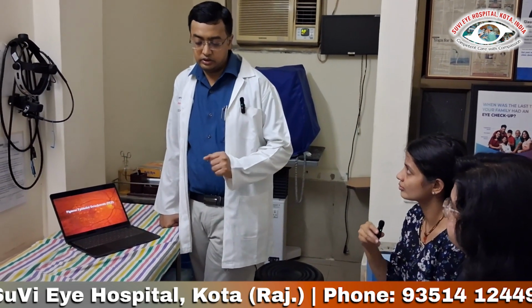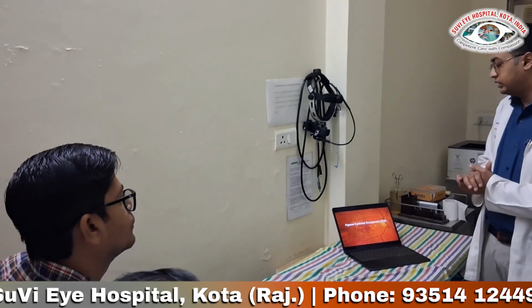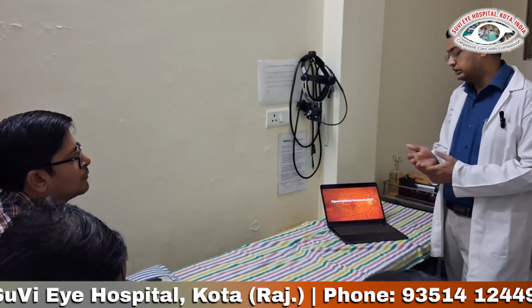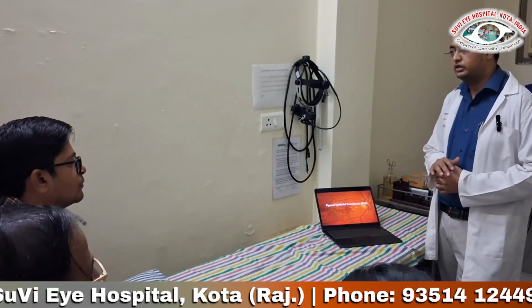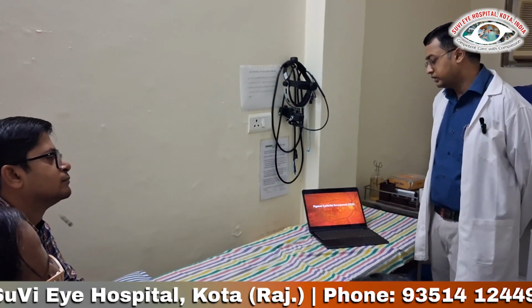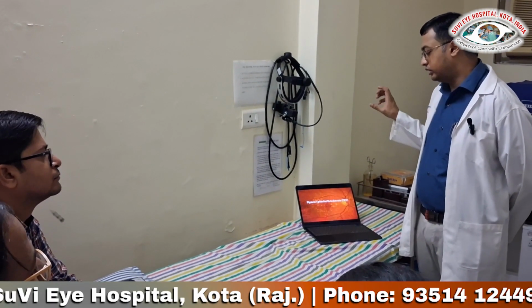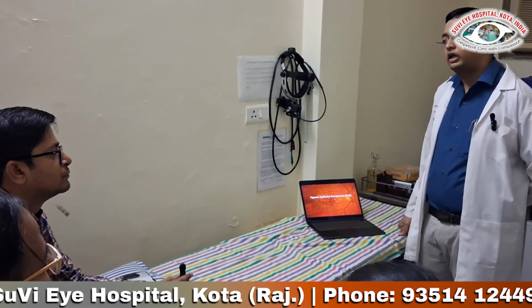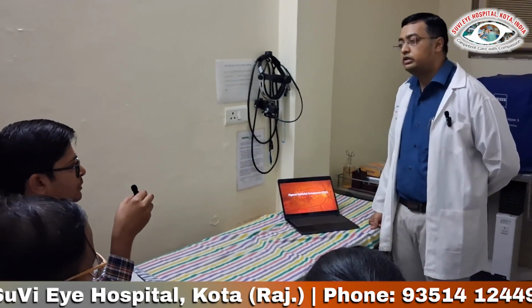So Dr. Sudhanshu, we discussed OCT; ICG is not available everywhere. Fewer places have ICG. ICG was the gold standard for diagnosing choroidal pathologies like polypoidal choroidal vasculopathy. So what are the OCT-based diagnostic criteria for PCV? The 4 diagnostic criteria that we discussed.